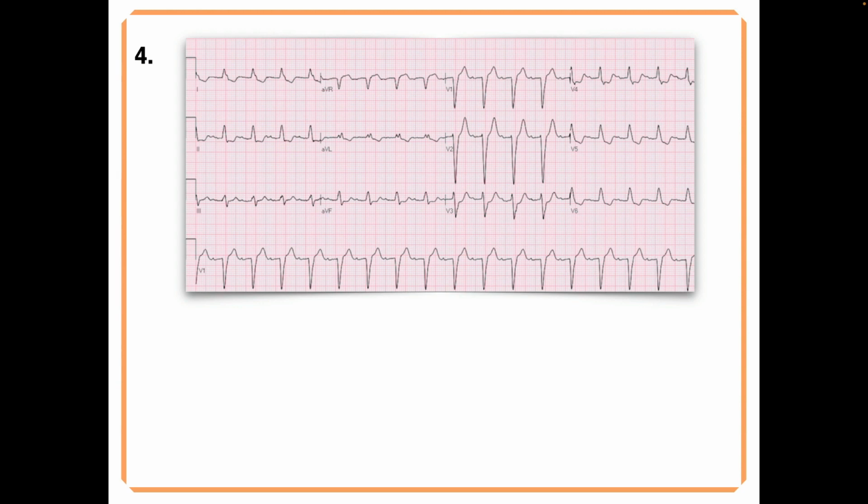As far as A, do you still want me to do it? If we meet criteria in this, then it's not that. You just want to double check, because I've seen some that have both. You don't have to do it out loud step by step, you can say yes or no. No, so that's it. So again, this is Sgarbossa B.